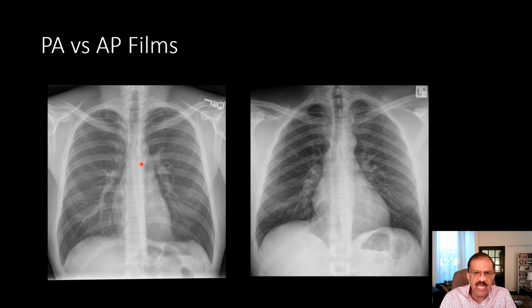So first of all, you make sure that the patient is not rotated. Then you identify various normal structures. Now let's start from here. You can start from anywhere, but I think this may be a good point to start. First, identify the trachea. This black column is the trachea. Now I'm sure you all know the basic principle that on X-ray, whatever is dense is shown white. Heart, for example, bones, liver, all radiodense structures are shown white, and all translucent structures are shown black.